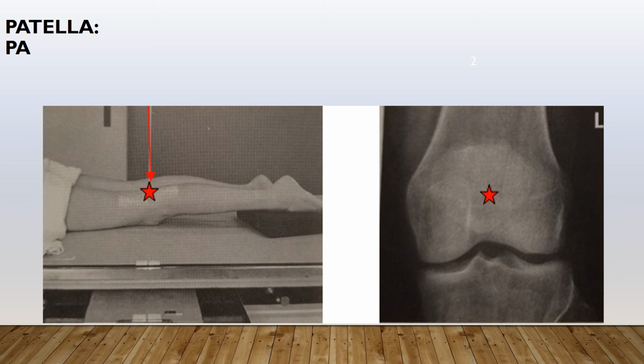When we're looking at the image, the knee joint and patella are outlined throughout the distal femur. There is no rotation. Femoral condyles and intercondylar eminence are centered, and the soft tissue and sharp bony trabeculation are clearly demonstrated.